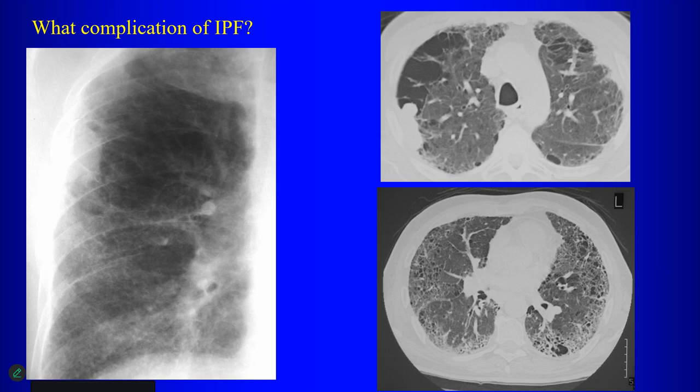Like a mass in the right lung? Yeah, so this thing over here turns out to be a lung mass, right? So what's that going to be?